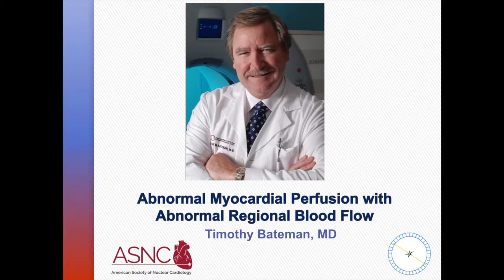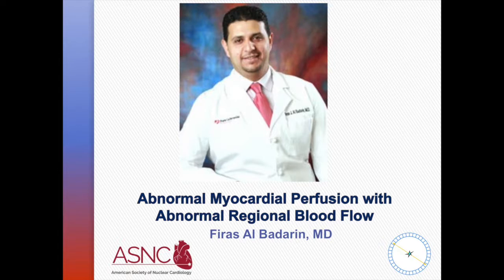Okay, thank you. Now, so that's a very severe reversible defect. What thoughts are going through your head at this point in time? You know, classically, when interpreting relative myocardial perfusion imaging in general, you always worry about underestimating the true extent of anatomic disease, and that what you're seeing is just the tip of the iceberg.